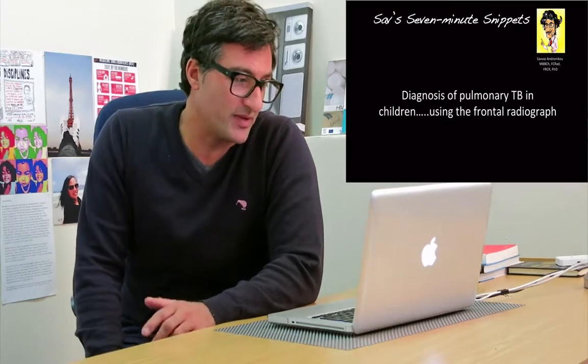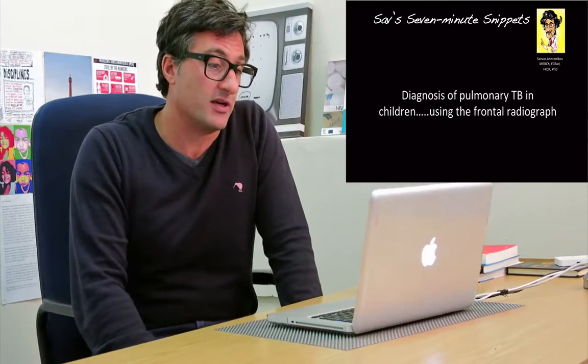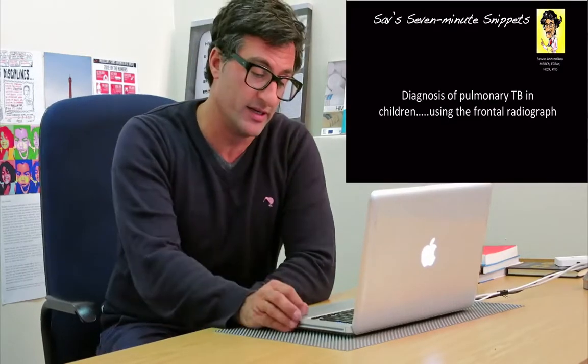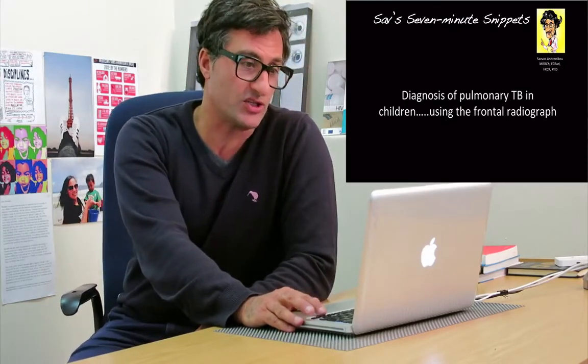This lecture is about diagnosing TB in children, and in particular using the frontal chest radiograph, because we're going to use another lecture to look at the lateral chest radiograph. The lecture is designed for use by anybody working with children and needing to make a diagnosis of TB, and it's intended that these skills help you make a diagnosis at the point of care. Of course, radiology knowledge is wider than this and would allow you to make better diagnoses about other conditions as well. So let's get started.